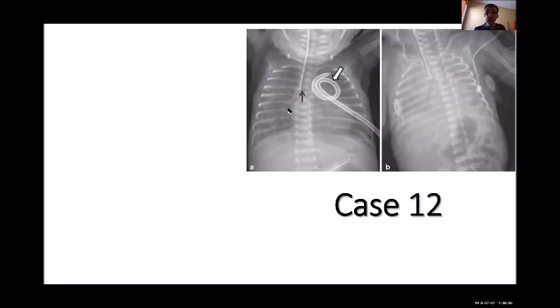So in my view, this is a poorly ventilated patient, with a poorly attached ETT and a poorly inserted chest tube, resulting in chronic lung disease. Now, chronic lung disease is a clinical determinant, but the pathology would be BPD. So this is bronchopulmonary dysplasia. Does that make sense to you?